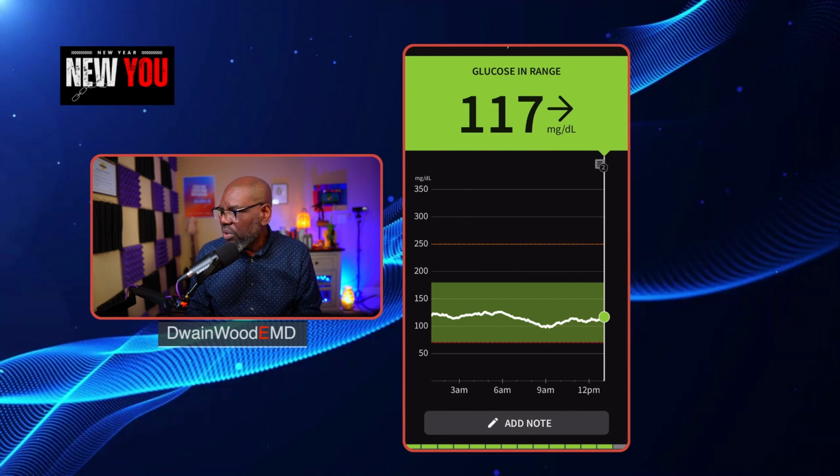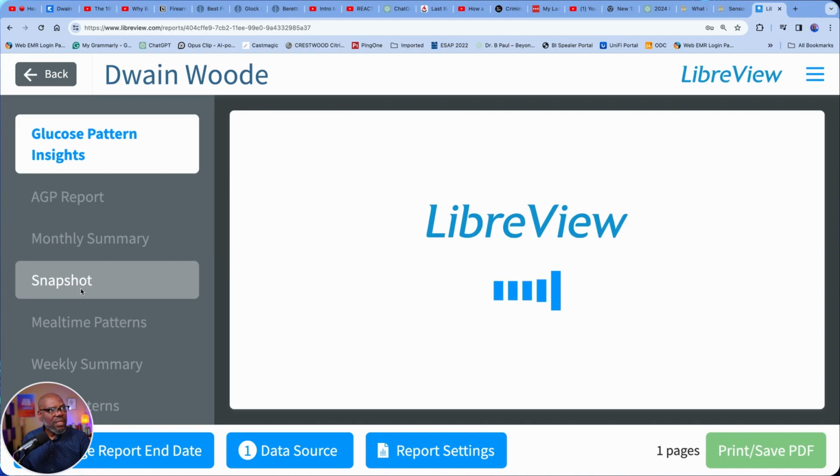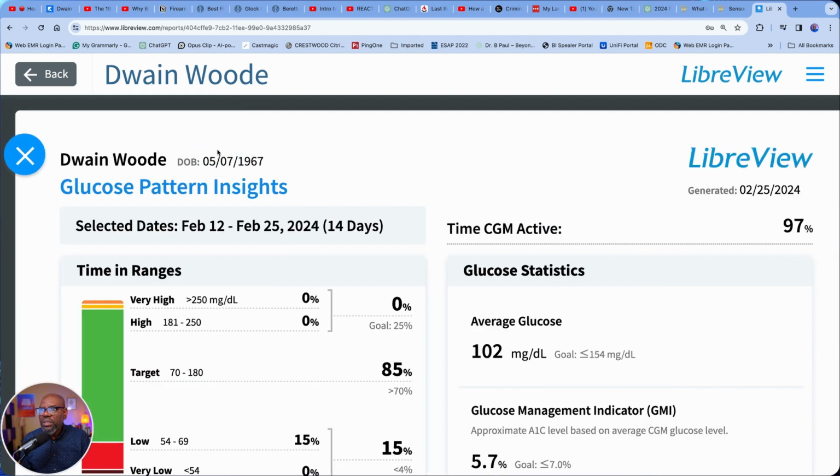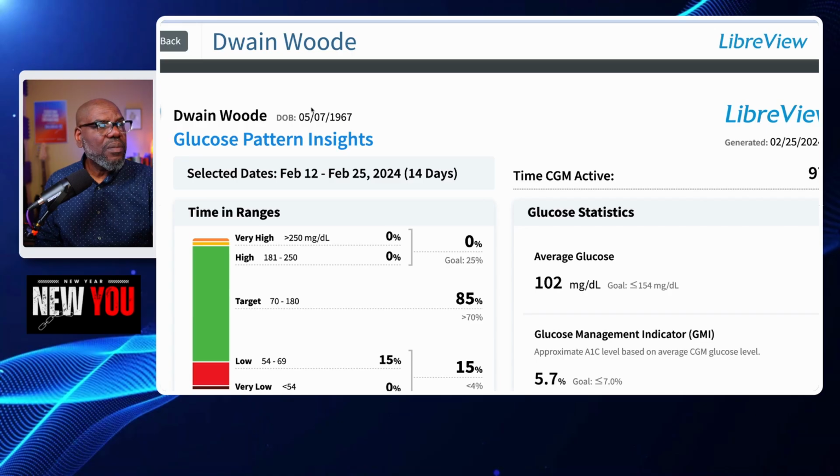So what I'm doing is I'm pulling that up, and then let's pop over and take a look at that. So this is what that report looks like. Let's go ahead and do this one. And actually I have a new view that I want to try out. So let's do that right now. Let's do this one. Okay.